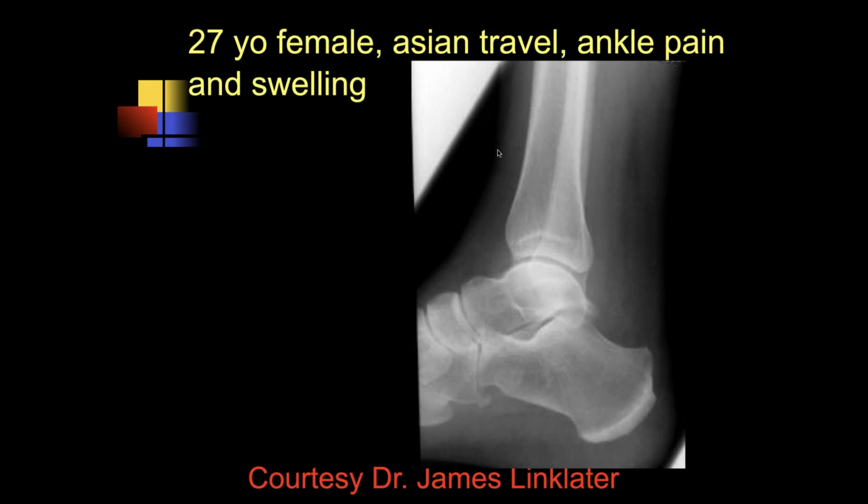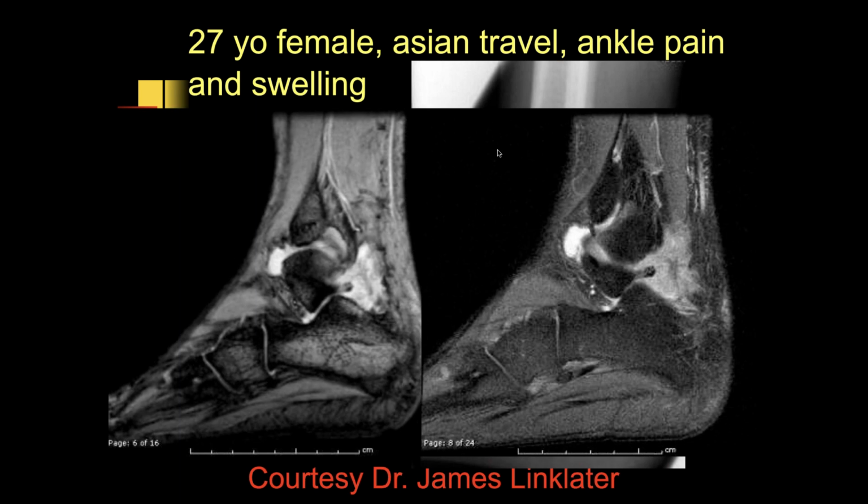Michael. Okay, 27-year-old female. Asian travel, ankle pain, and swelling. There might be some soft tissue. So I'm looking at the bones. I'm not sure I'm seeing too much on the bones.